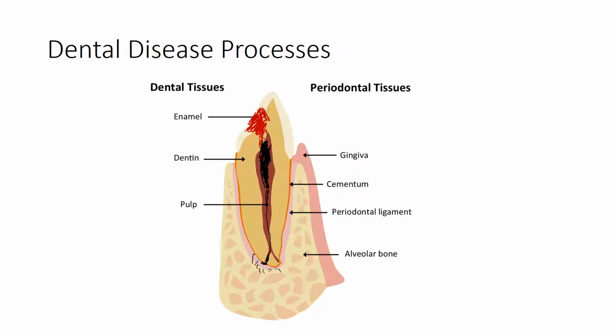And that's essentially decay. The inflammation around the apex will cause a reaction, typically resulting in resorption of bone, but occasionally resulting in sclerosis. The resorption of bone can be from an abscess, it can be from what's called a granuloma, which is really just a granulation tissue, and an epithelial lined cyst from embryologic dental remnants can form in this region as well in response to the inflammation.